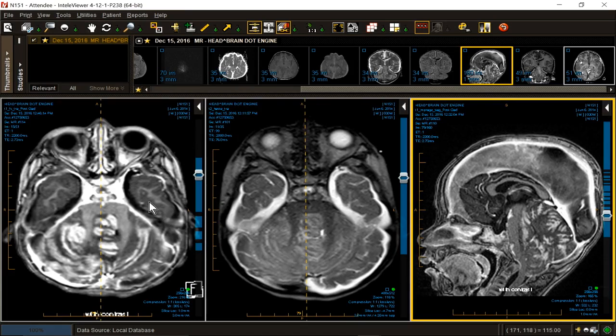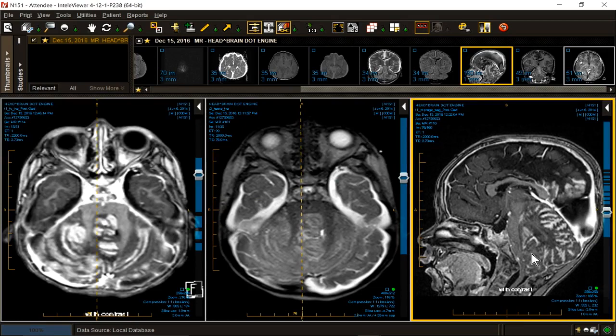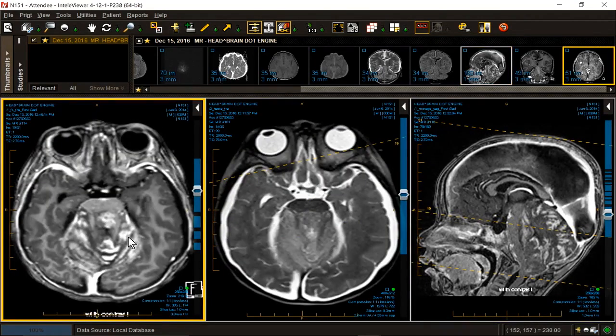It enhances wildly. Portions of the mass centrally enhance, but it also has enhancement throughout the leptomeninges, the delicate pia arachnoid invaginations. That's apparent both in the axial and the sagittal. But let's not forget that there is also a dural, thick pachymeninges that is more smooth. Now, when it's lumpy bumpy, we worry about carcinomatous meningitis, sarcoidosis, other. When it's smooth, we worry about intracranial hypotension and or overshunting.